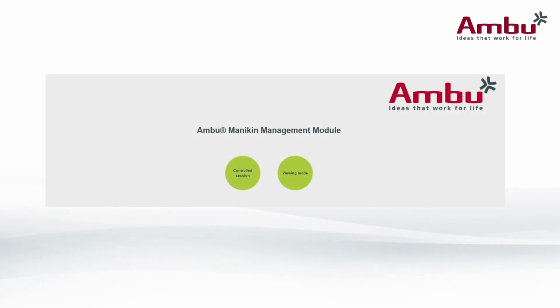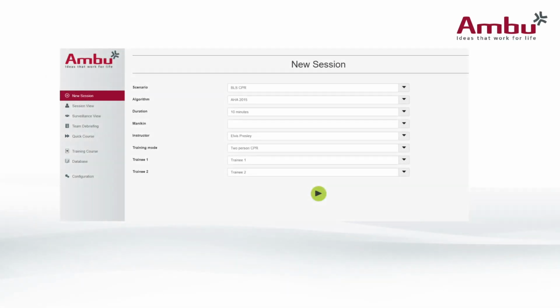AmbuMan Advanced has different access, viewing, and control modes for training with instructors and students. The controlled session allows the instructors to have complete control of the training. It is also the area where the administration of the database and stored scenarios are accessed. In a controlled session, instructors can fully customize their training sessions on the AmbuMan Advanced.